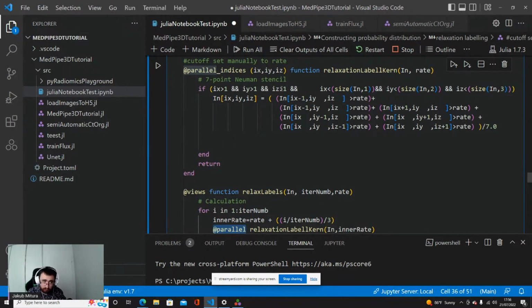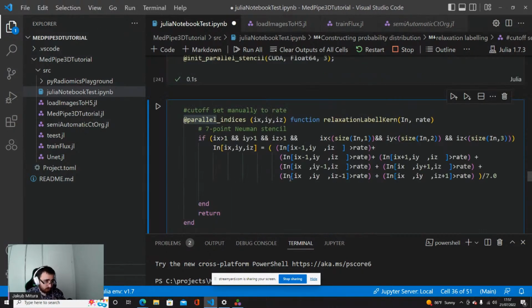It's important: if you have a lot of noise, this will help to reduce it, because noise generally will be isolated. In case of noise, it may decide that there is a liver, for example, somewhere in the brain, but there wouldn't be many voxels around that also say this is a liver. So we are using, one more time, the data from the local neighborhood.